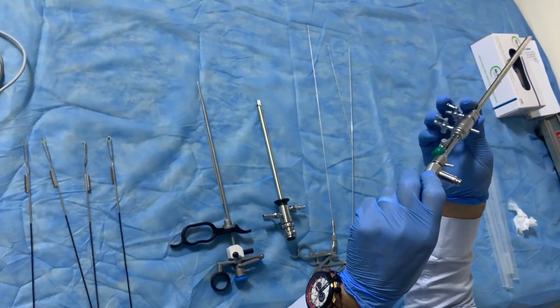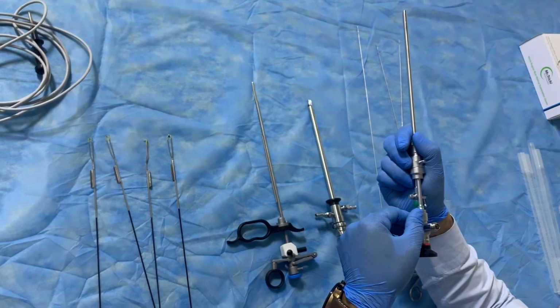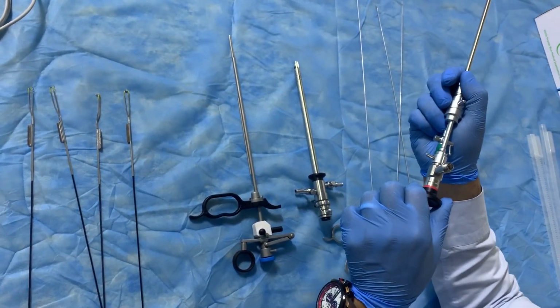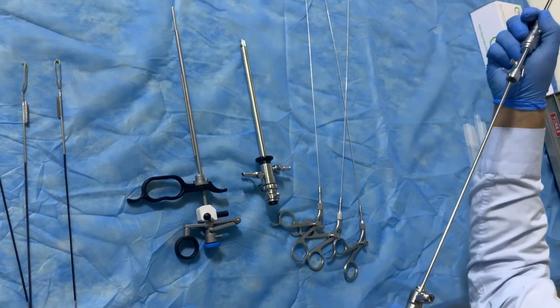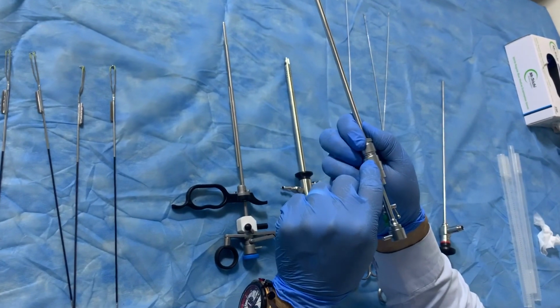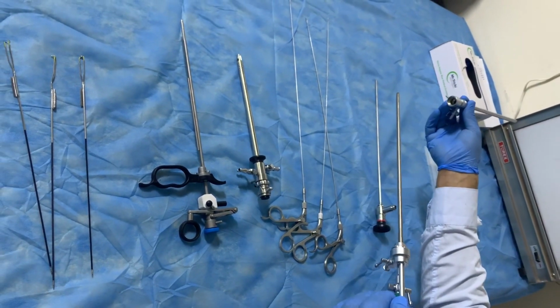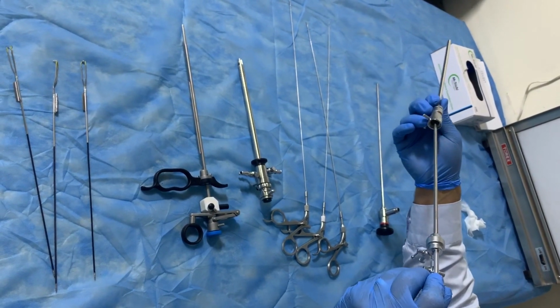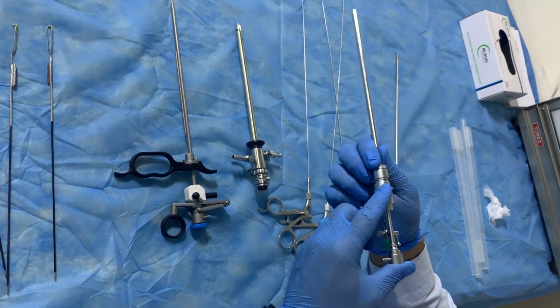So this is the therapeutic and diagnostic hysteroscope. Don't forget, the lines should be parallel to each other to be separated. Now this line is parallel to this line. Now the telescope is out. This line should be parallel to this one to separate the telescope. When we want to fix it, the lines should be parallel, and then turn clockwise to close.